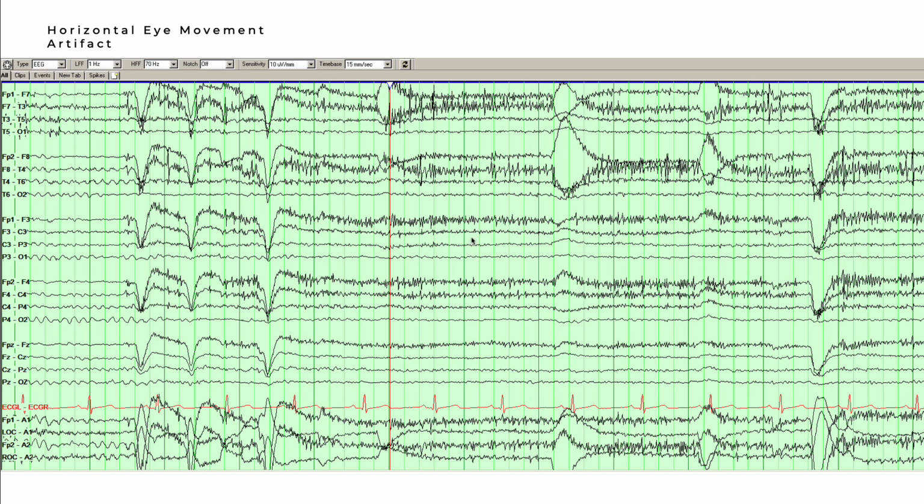So if you're looking at this patient, you're seeing this eye movement here. Which direction are they looking if the positive phase reversal is here on the left side? If you guessed they're looking left, just like that example, you would be correct.